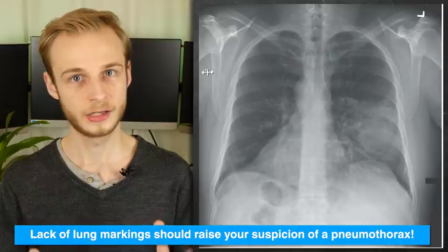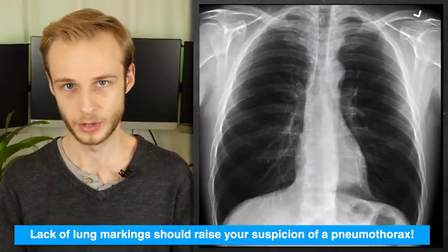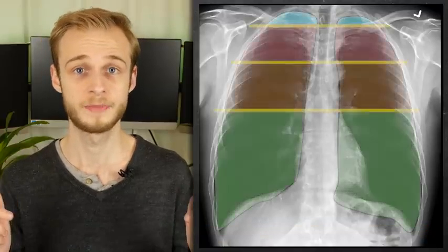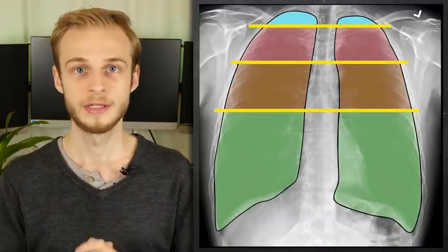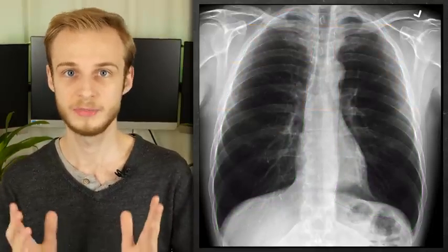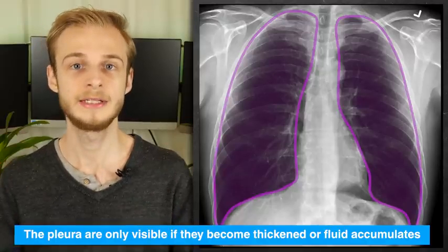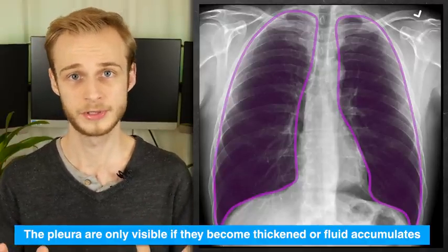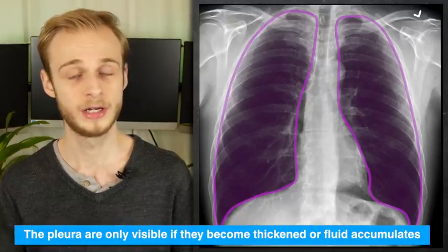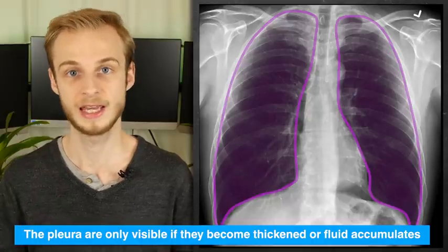But if you can't see any lung markings at all, this should make you highly suspicious of a pneumothorax. Also, it's important to check the apices, the very tops of each lung, before you move on. Now, also under the breathing category come the pleura, which should not normally be visible. You just need to check that the lung markings extend completely to the edges of the lung fields. Abnormally thick pleural layers can be due to things like mesothelioma, or blood might accumulate in that space in the event of something like a hemothorax.